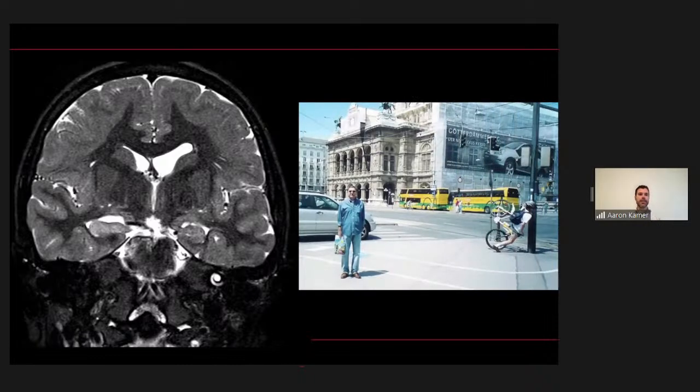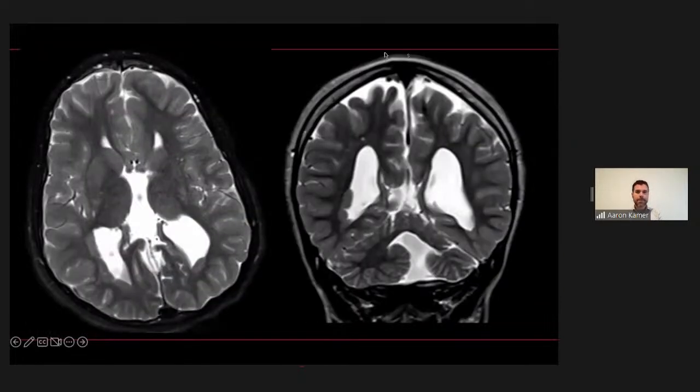And I think it's a good idea to complete your search pattern even on a case where the abnormality is fairly diffuse, and you may be able to localize something that's a little bit more focal, that's potentially amenable to some treatment. Nicely done. Okay, let's see.